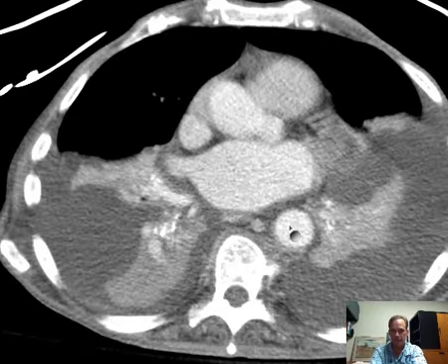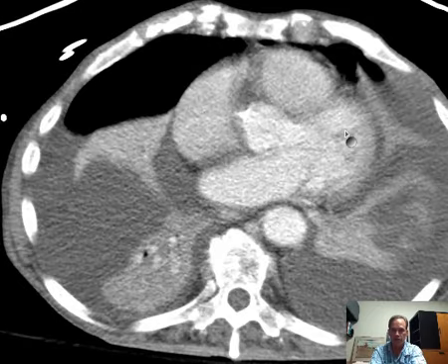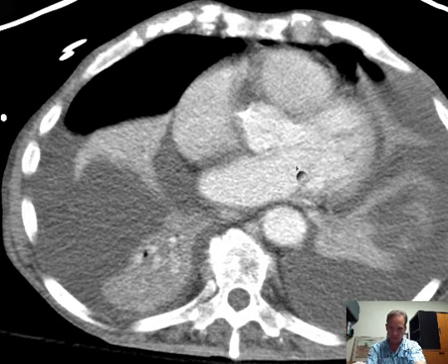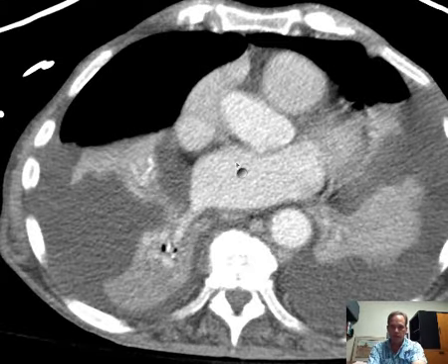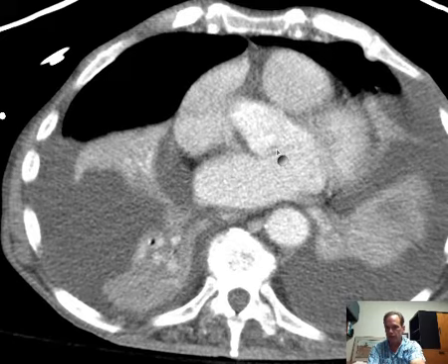So let's look at that again and get this firmly in mind, that you have a left ventricle and you have a right ventricle. The left ventricle gets blood from the left atrium and gives it out the aorta. It comes from the left atrium to the left ventricle to the aorta. The left atrium goes into the left ventricle, goes out the aorta. So the aorta and the atrium are kind of forming an angle with the ventricle.